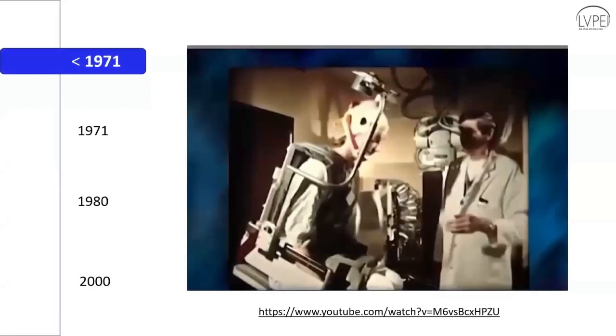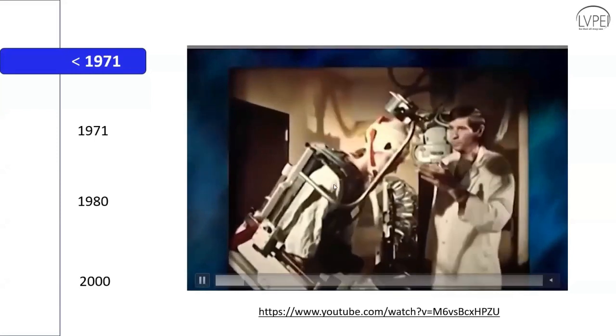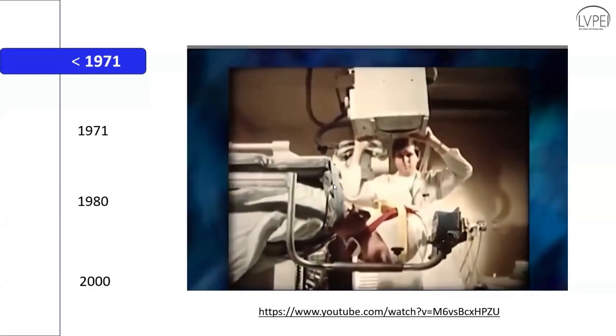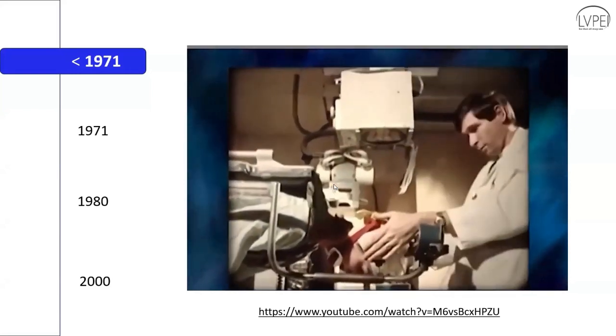Before CT, there was an examination called pneumoencephalography, in which a patient was strapped to a chair and air was injected into the spinal column, and the patient was turned upside down and sideways. Here, air would move up to the ventricles and an X-ray was taken. Any difference in the size of the ventricle would be suggestive of a mass lesion. This procedure was very painful and would induce vomiting and headaches in patients.